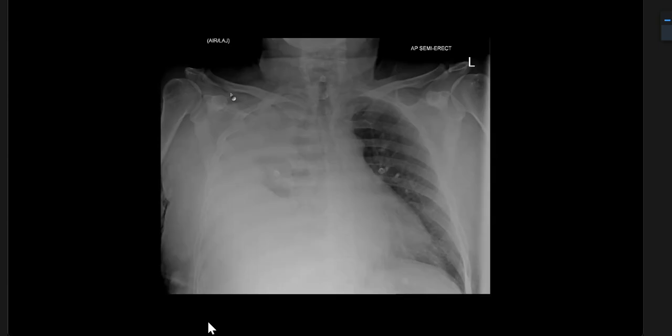I don't know the cause, but it could be anything. It could be a large pleural effusion. It could be PE causing massive edema. It could be unilateral pulmonary edema. It could be a trauma. If I cannot see a rib fracture, it could be a trauma leading to hemothorax. This patient urgently needs a CT scan. That's it. There's not much to say here.